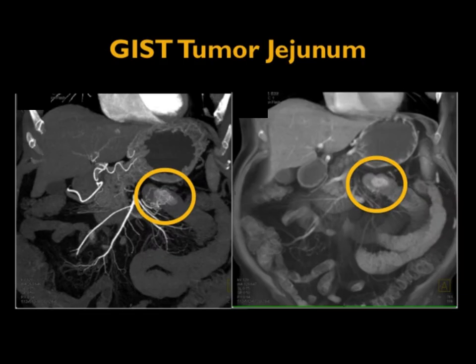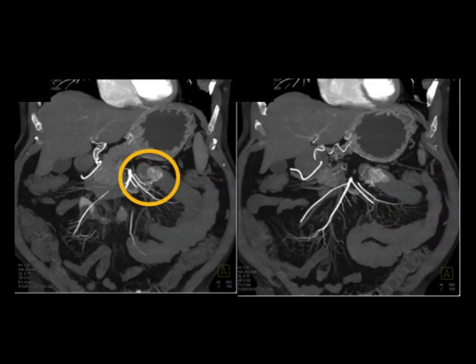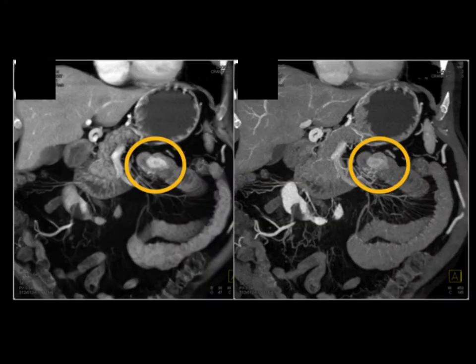Another example, GI bleeding. There's a mass in the proximal small bowel, past the ligament of Treitz. Here it is with MIP. Beautiful example of a vascular intraluminal lesion. You might think about carcinoid, but there's no desmoplastic reaction. You could think about metastasis from a renal cell, but the patient has no renal cell. You better be thinking about a GIST tumor. Beautiful example of an intraluminal GIST tumor. And again, the point is they present with GI bleeding.